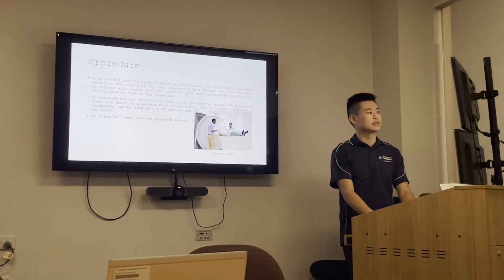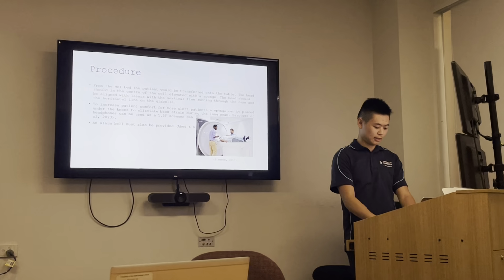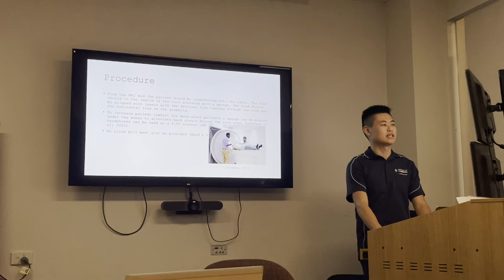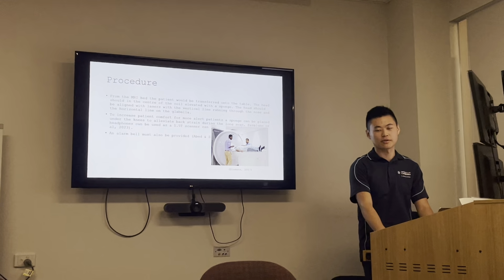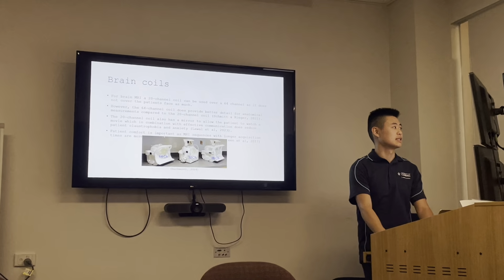Earplugs or headphones can be used as the 1.5T can hit 130 decibels. So that's a sponge just under there, just for longer scans. And an alarm bell should also be provided.